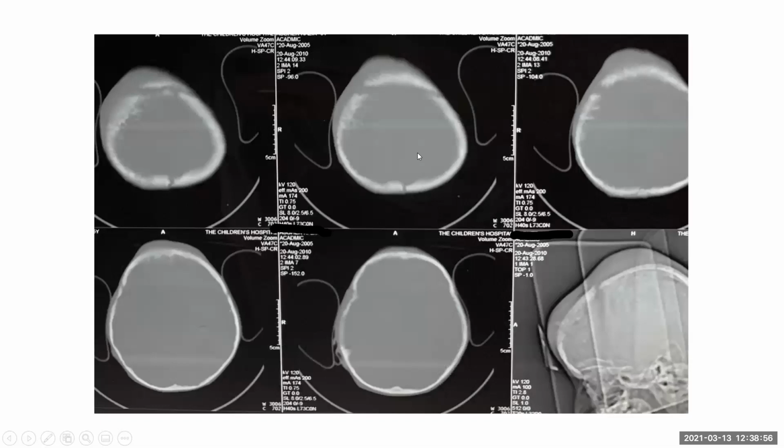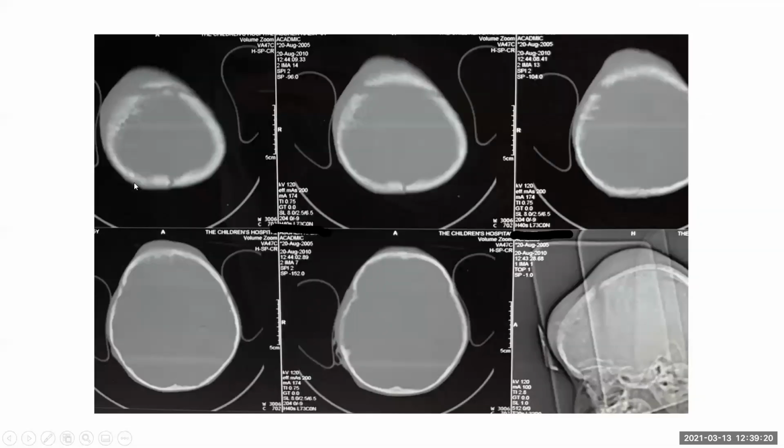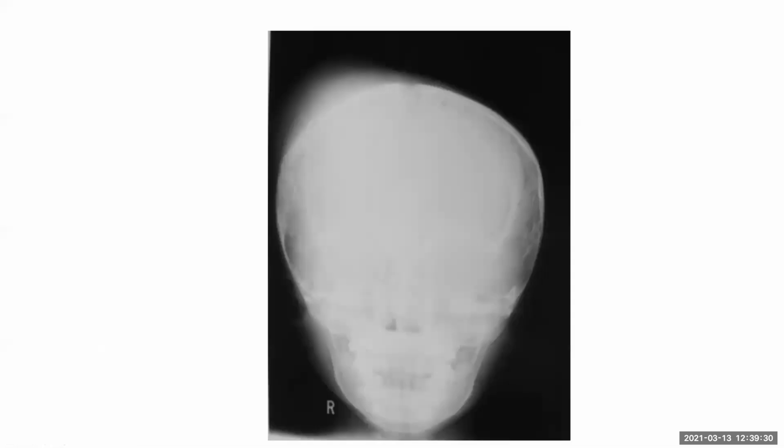And very rightly, you said there's compression on the ipsilateral lateral ventricle and midline shift, which is also very important to tell. And yes, there is vasogenic edema. These are extraaxial masses, right? We must say whether intraaxial or extraaxial. And when they are surrounding the bone on all sides, then yes, they are arising from bone. You can see the separation of sutures. This is another thing that indicates that these are neuroblastoma mets, right? And this was rightly done.